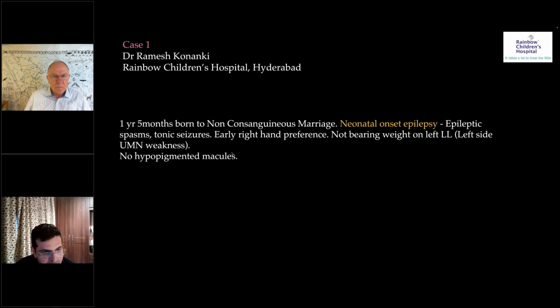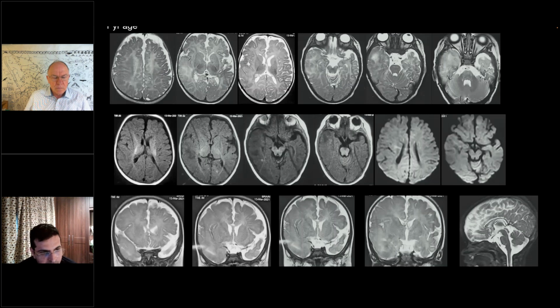I agree with your observations, Nihaal. And with these cases, you have to be very careful looking at the contralateral side, which might appear normal instantly, but might have some lesions as well. It's very hard to comment on some selected images. But there is a difference in the way the brain is folded in the frontal and the rest of the opercular region on the left as well. So it's important to go back to the EEG to make sure that this is just coming from one side of the head, or whether you've got some seizure activity from both sides.